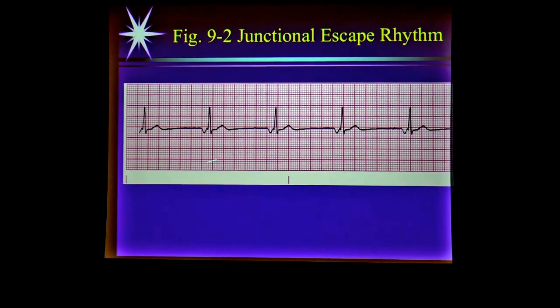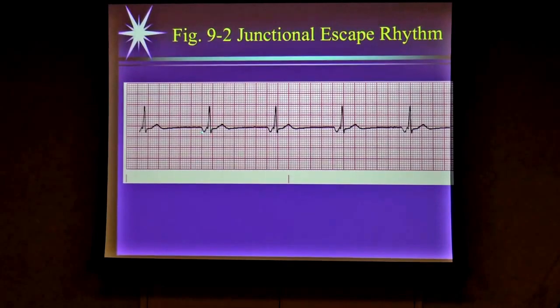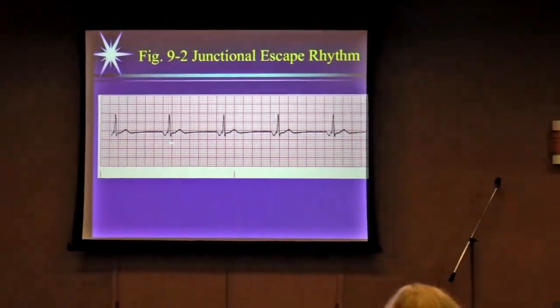So can everybody make out the only thing that's different from a sinus bradycardia? What is it? Inverted P waves.